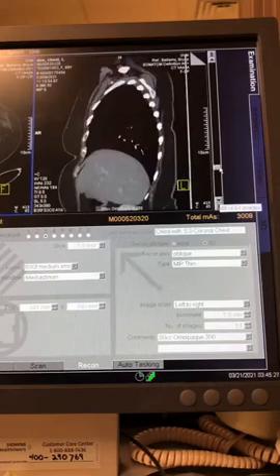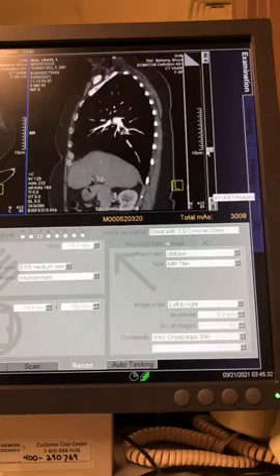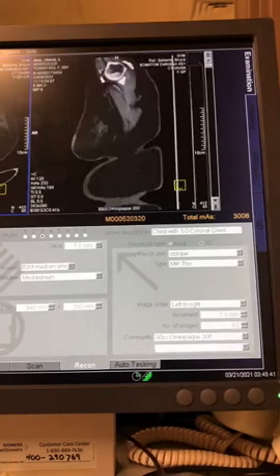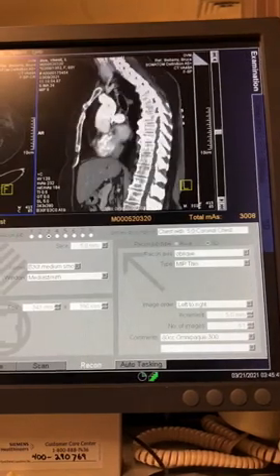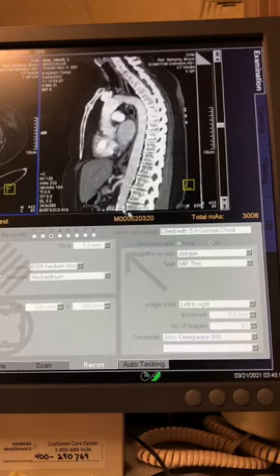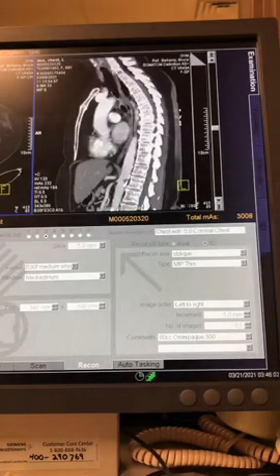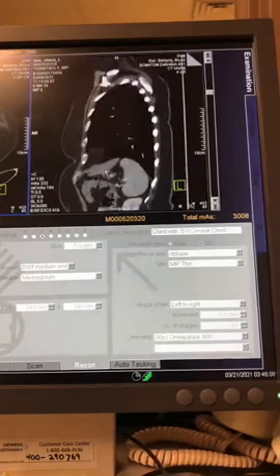And remember, this is an MPR, or a multiplanar reformation. A lot of times you guys are going to hear me mix recon and reformat up and use them as synonyms. They are not. I looked at your midterm. It looks like each of you understand the difference, but still, look how cool that is. So if you wanted to see the aorta, this is a money shot, right? It's gorgeous. To see the descending aorta, you can see the calcifications in the aorta here and here, those bright white spots. You can see the sternum. So like if this was trauma, our standard protocol would also include sagittals, because you could put this in a bone window and see the T-spine, all this stuff, okay? So just a massive amount of information that you get from a CT.